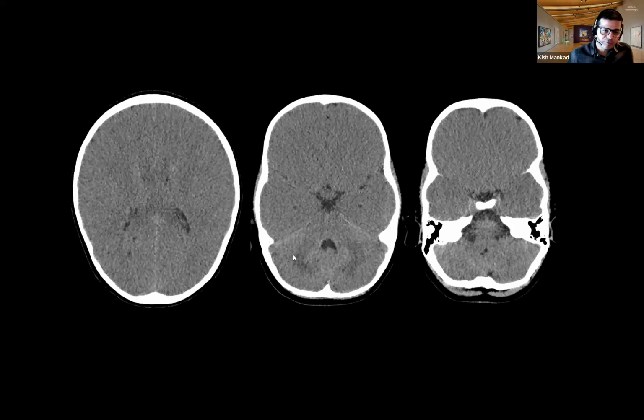Not only do you have what looks like swelling or no space left in the head, you have squished ventricles. And if you asked me, is there raised intracranial pressure? Of course, it looks like raised intracranial pressure, except that it was not. Also, on closer inspection, we begin to see a little bit of periventricular calcification. So you have to raise the possibility of a metabolic disorder here.